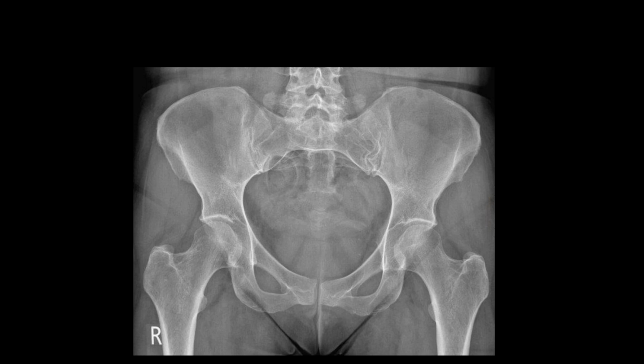Shenton's line exists over here, so it's the line that follows quite nicely from the femur through to the inferior border of the superior pubic ramus. What we should see, like we do in a normal pelvic x-ray, is like this, a very smooth line. So if I write that, Shenton's line. Any changes to this line, for instance, if we have the line either go off more like that, or sometimes we might see the line kind of have a more steeper change like that. These are usually suggestive of neck of femur fractures.